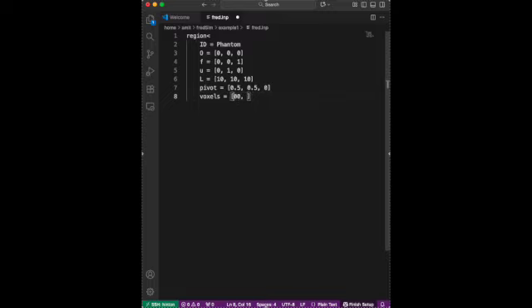If I set it to 200 here, then 100 millimeters divided by 200 will give the exact voxel size of 0.5 millimeter cube. So let's keep it as 1.